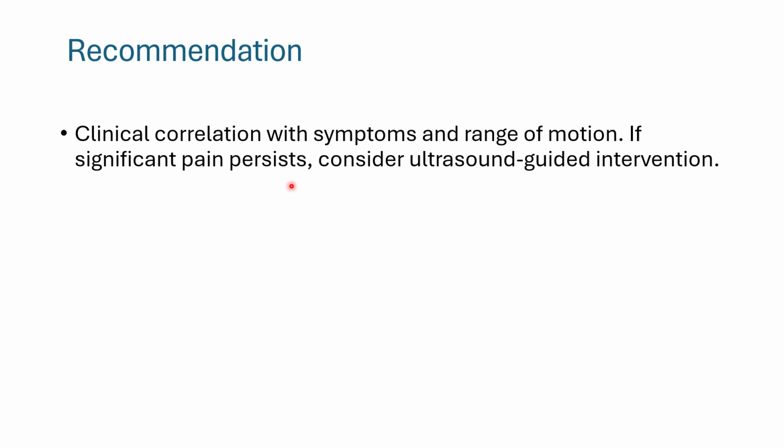If there's no effusion around the calcification, normally just report it as a supraspinatus calcification. Don't add the tendinitis part. But when there are signs of inflammation, so you can know if there is inflammatory exudate or fluid around it, then you can flag it and decide to put the jargon calcific tendinitis.